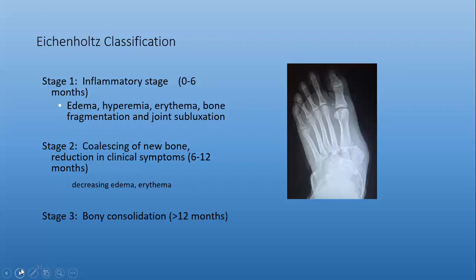Can I ask a question? Would you see this much soft tissue edema in coalescence? Well, I guess you do because it is coalescence, but I would think it would have gone down more at that stage. Where do you think there's edema? On the medial aspect of the foot. Okay, yeah, I would guess that's either the bowing of the skin because of the medial cuneiform being shoved to the side, or it could be edema. I'm not sure, but okay.